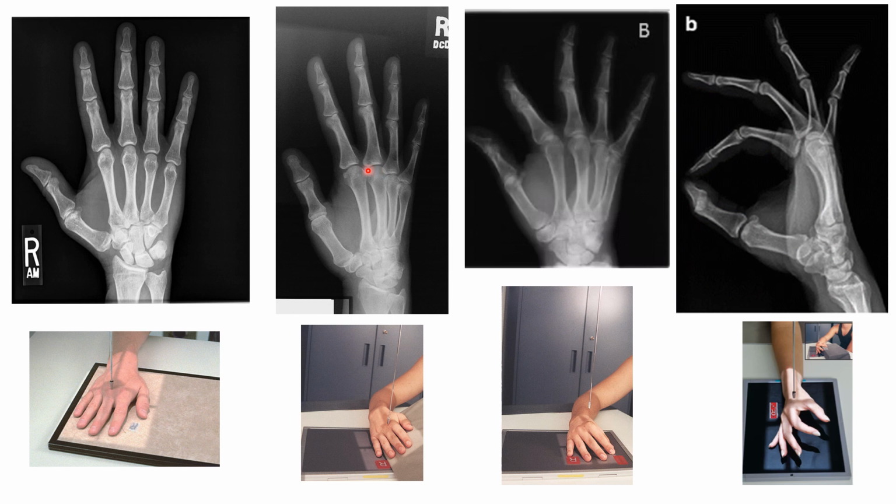Now, sufficient obliquity of the hand would be a 45-degree oblique, and we measure that by looking at the space or distance between the metacarpals.